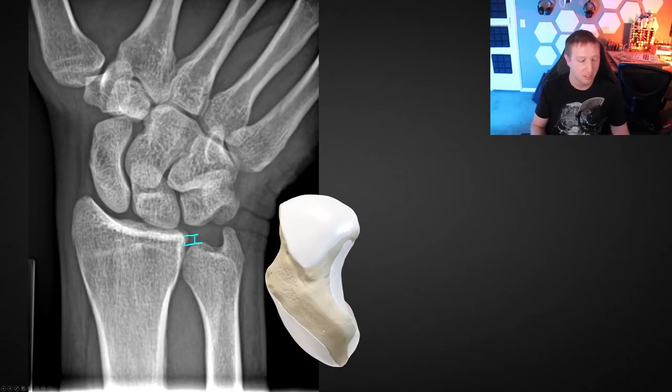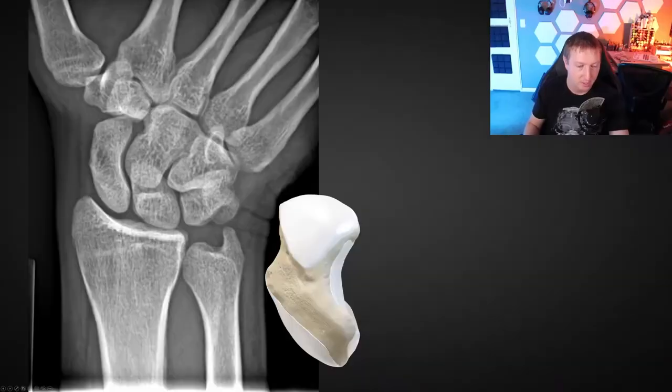For example, when we take a wrist x-ray, oftentimes it's on a table, some distance below the shoulder. But to get true neutral ulnar variance, we would need to take the x-ray at shoulder level, and usually we don't do that. When you put your arm down like that, it applies a little bit of proximal tension on the ulna, which will cause up to 2 millimeters of physiologic radiographic shortening. I drew that here, you couldn't see it. So, proximal tension on the ulna.